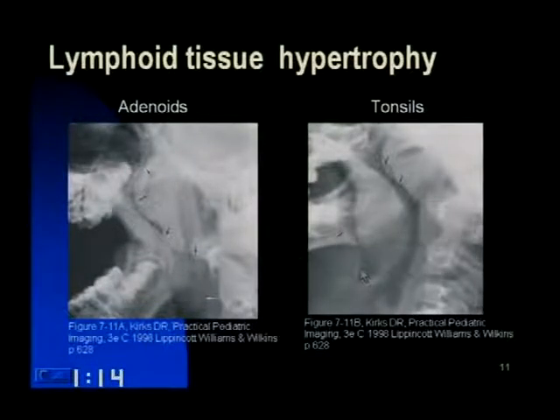These findings are secondary to inflammatory infectious etiologies: beta hemolytic streptococcus, rubeola, Epstein-Barr virus, Coxsackie virus, and adenovirus. These may enlarge and obstruct the nasopharynx and or eustachian tubes. The finding on the left is secondary to a mass in the posterior nasopharynx, secondary to enlarged adenoids, or the finding on the right is secondary to a mass at the end of the uvula, secondary to palatine tonsils. And this is lymphoid tissue hypertrophy, very common.